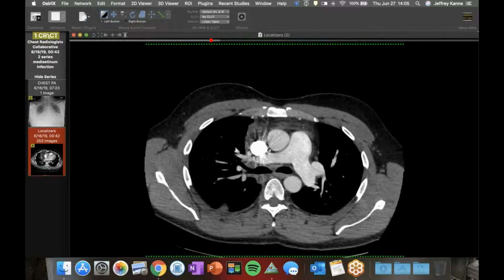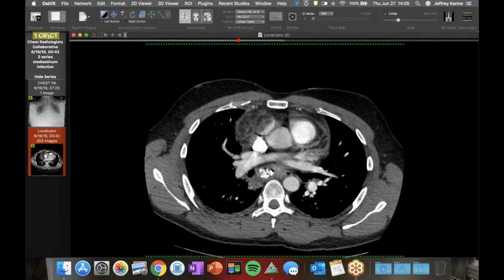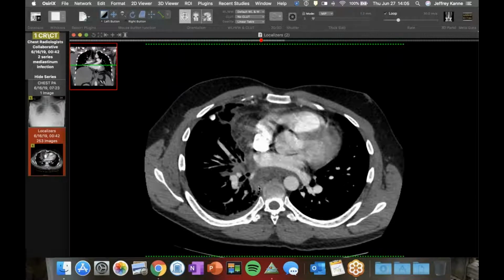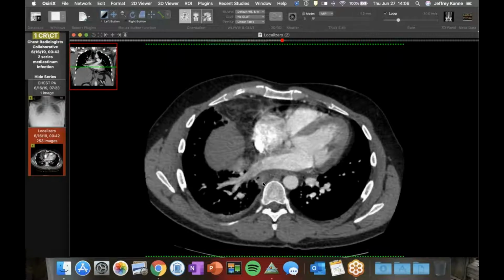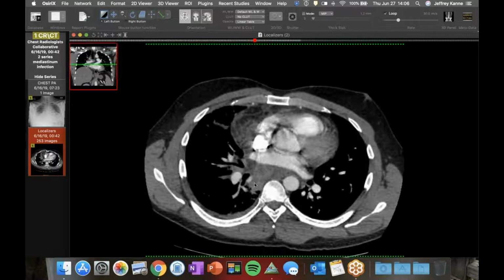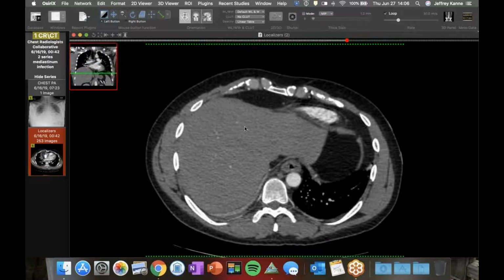And you can see on the CT here that there's this stranding in the prevascular mediastinum. And then interestingly, in this subcarinal space, you've got this calcified lymph node with gas in it. And then in the medial basal right lower lobe, there's some consolidation, maybe, or at least some thickening soft tissue in that region. There's a little pleural effusion here. So some sort of mediastinitis or something. It was unclear what was going on, whether there was a lung infection that had seeded this. Is this tuberculosis? But there's no real discrete collection, just the stranding.